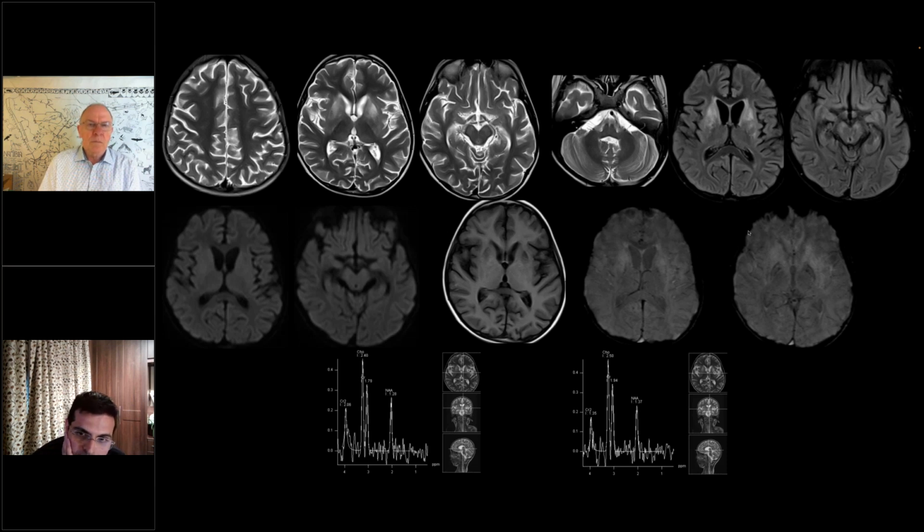Nihaal, question for you: are the mesial temporal structures involved? Is the limbic system involved? I can't tell from those last. No, they're not. The temporal lobes are usually hyperintense in our scanners, so that's more scanner related. Is it scanner related? Okay, so we're not calling this limbic encephalitis like NMDA.